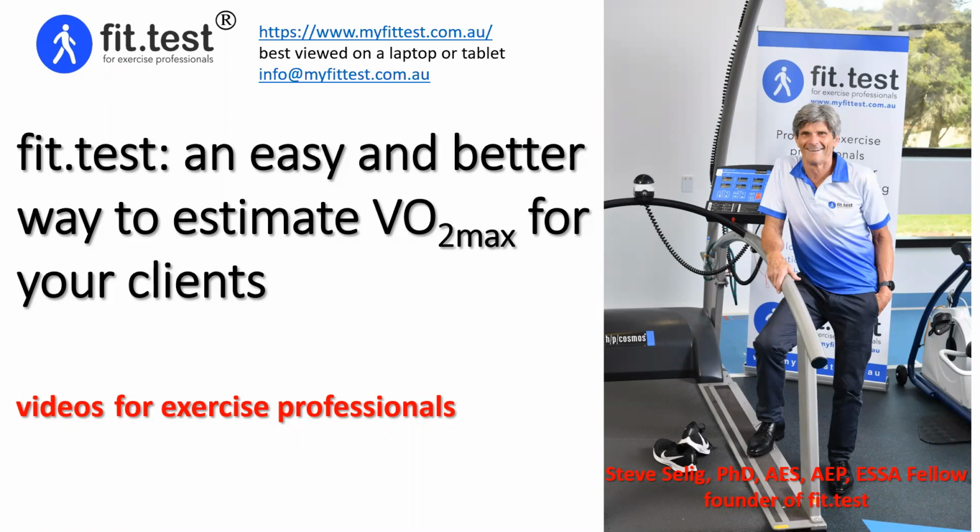The topic of this one is to just demonstrate fit.test and to show how easy it is to design and administer an individualized exercise test for the assessment of VO2max that really relates to the individual needs of your clients. It sounds difficult, it's incredibly easy.